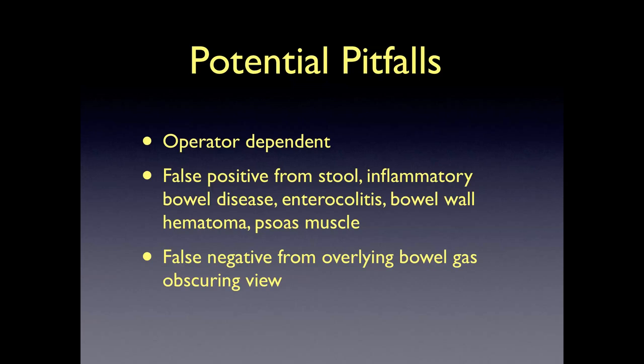Common false positives can be due to the presence of stool, inflammatory bowel disease, enterocolitis, bowel wall hematoma, as well as psoas muscle. Overlying bowel gas can obscure the view of potential pathology, creating a false negative bedside study.